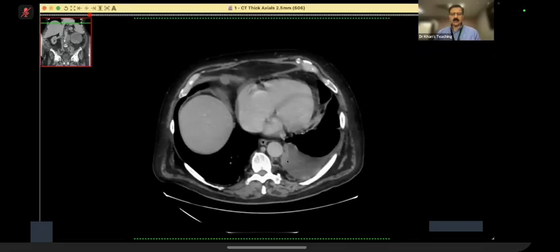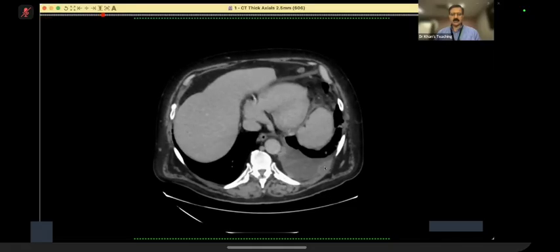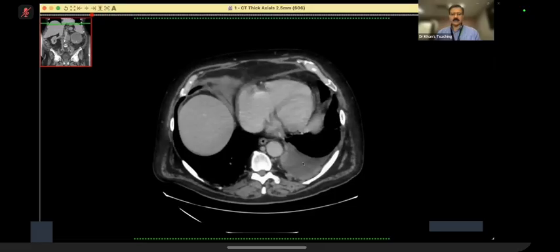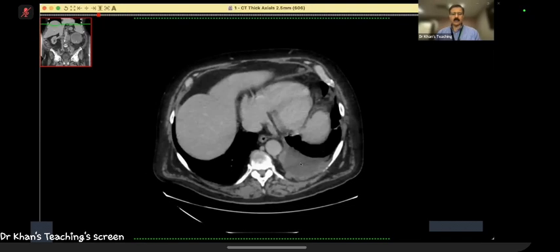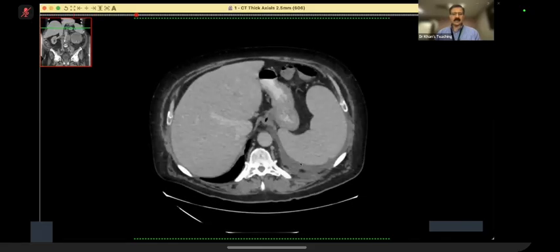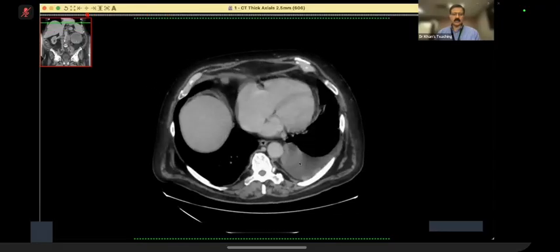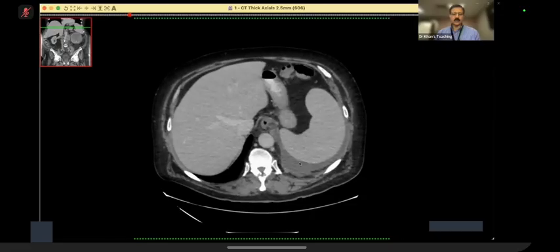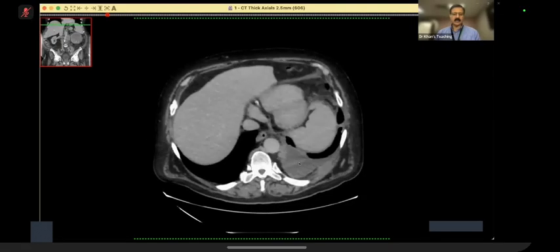Look here, how nodular and enhancing it is. And this is causing effusion. So somebody who has mentioned nodular pleural metastasis will definitely get half a mark more, isn't it? This is how the examiner is going to discriminate between those of you who will get 6 and those who will get more than that.